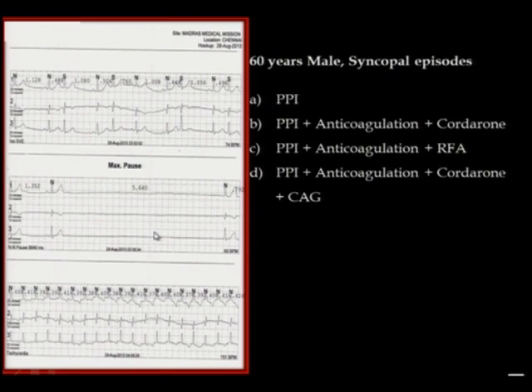PPI is definite. Now you have tachycardia and a bradycardia, and this bradycardia was definitely because of a sinus dysfunction. So we already now know this is a tachy-brady syndrome because of a sick sinus disease, where the incidence of atrial fibrillation episodes, even though here it doesn't look like, is so very high that during the tachy phase, there is atrial fibrillation, so he requires an anticoagulation.